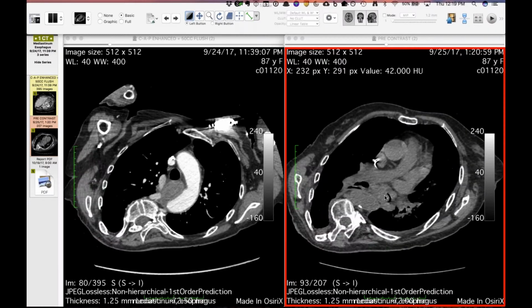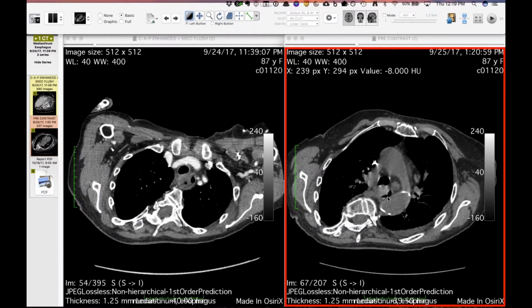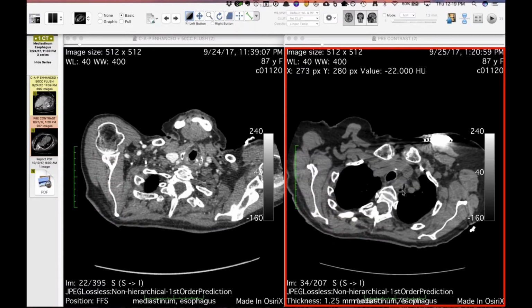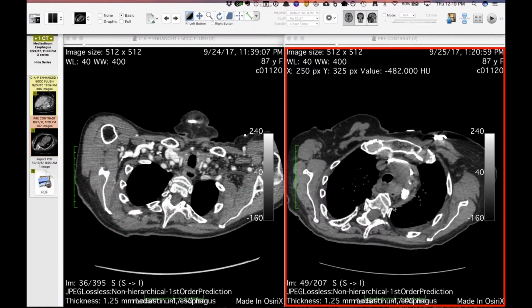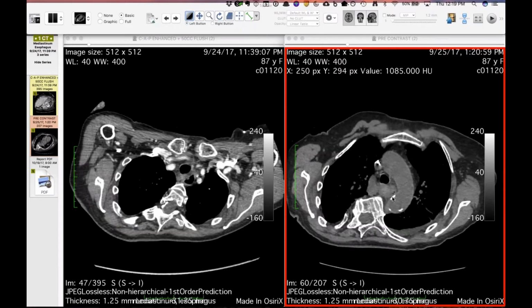And we don't know where the bleed was. I think she may have been anticoagulated and super therapeutic, but not a mass, and something that we don't see that often. And usually the cases I've seen have been in the setting of intervention, like a nasogastric tube that ends up dissecting in the submucosal layer. But important thing not to forget, I guess, on differential for longer segment abnormalities of the esophagus. And so, of course, she was treated conservatively.